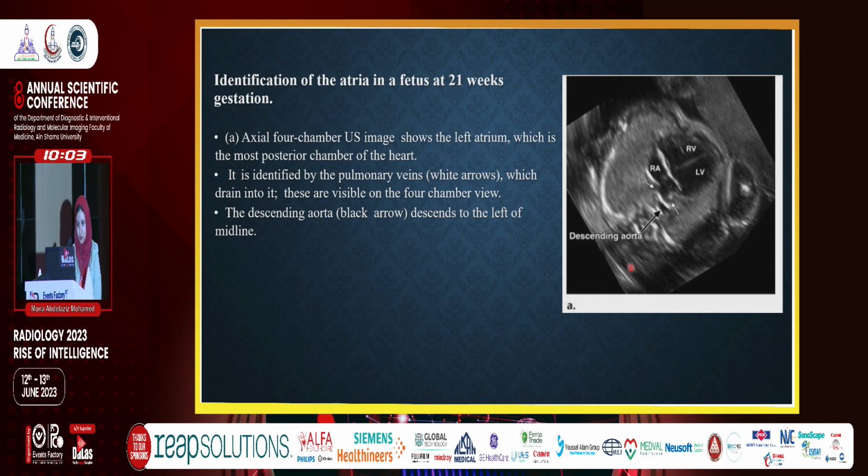The drainage of the superior vena cava and inferior vena cava into the right atrium will be shown on the bicaval view better.